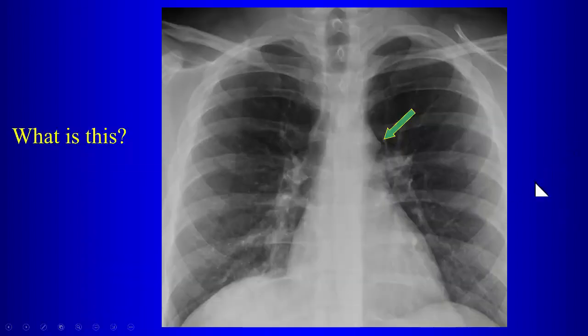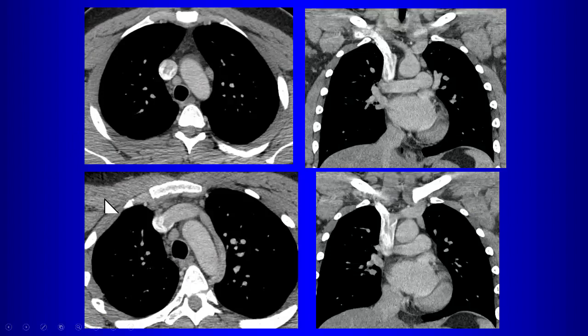Okay. What is the arrow pointing to? Superior intercostal. So otherwise known as the aortic nipple, right. So the aortic nipple is this round structure here that we can see next to the aortic knob, and anatomically that's made up by the left superior intercostal vein. So remember on the right side we talked about the azygous vein arching forward, joining the superior vena cava.